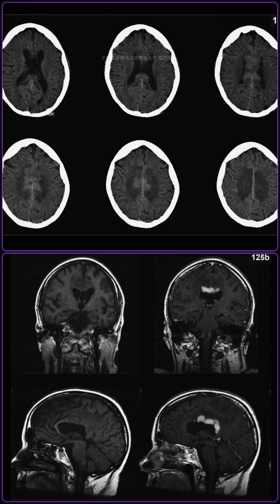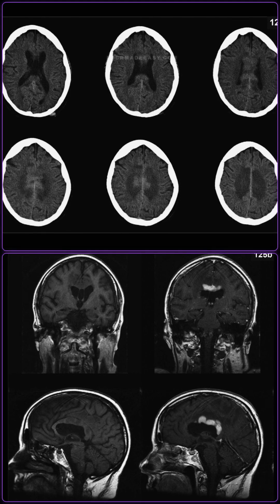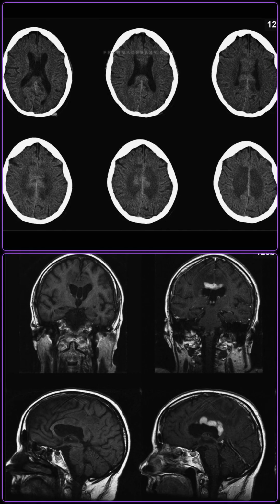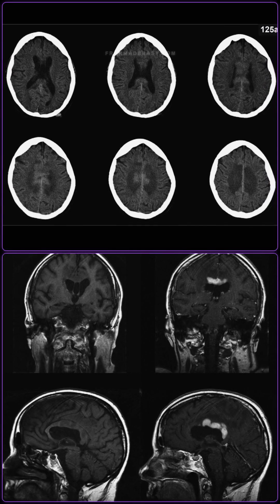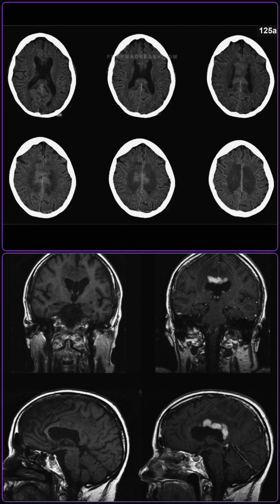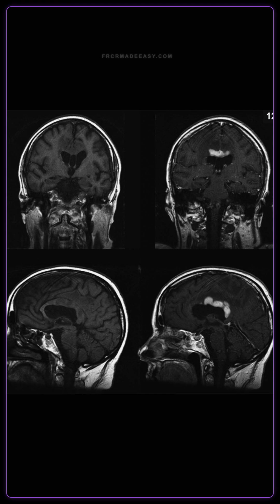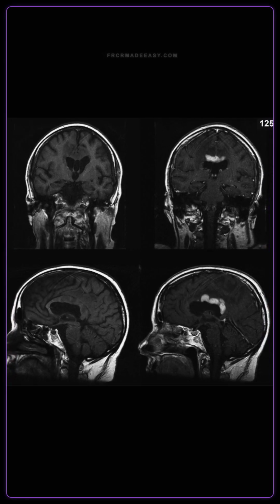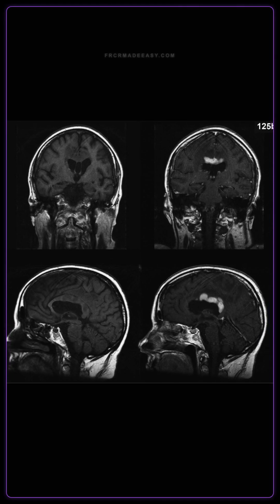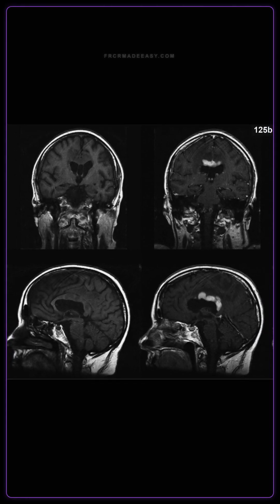The pre-contrast T1 weighted MR image shows the callosal mass as mildly hypointense. Following intravenous contrast administration, there is avid uniform enhancement of a lobulated lesion that crosses the midline through the body of the corpus callosum. I am showing you a magnified post-contrast axial T1 weighted MRI. What is the diagnosis and what is the differential for a corpus callosal lesion crossing the midline?